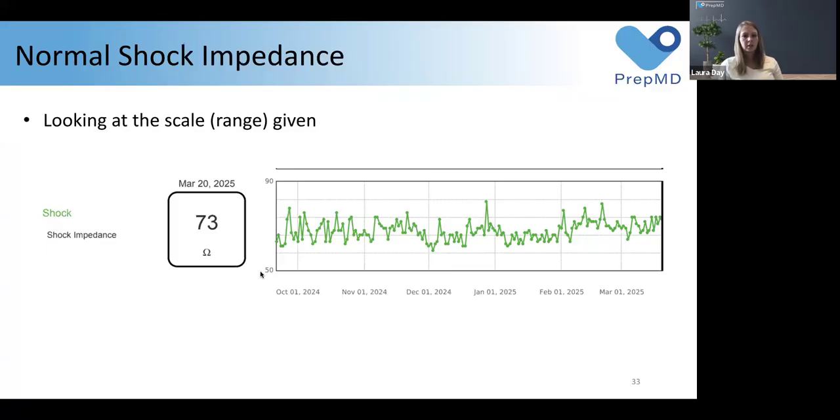And so being able to make sure you orient yourself to recognize what it is you're actually reading will help a lot, because if you thought that this was a large range, then some of these jumps might make you a little bit alarmed. But this is actually a very stable lead.